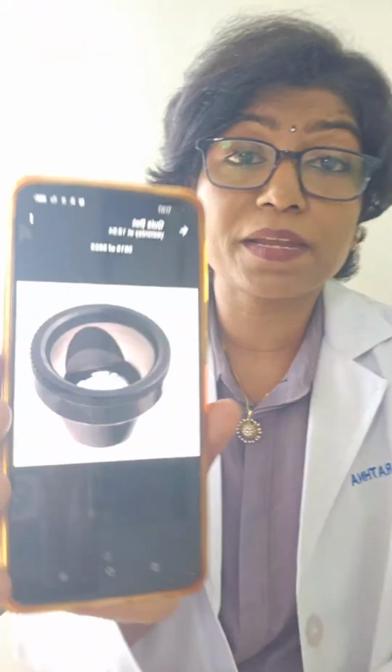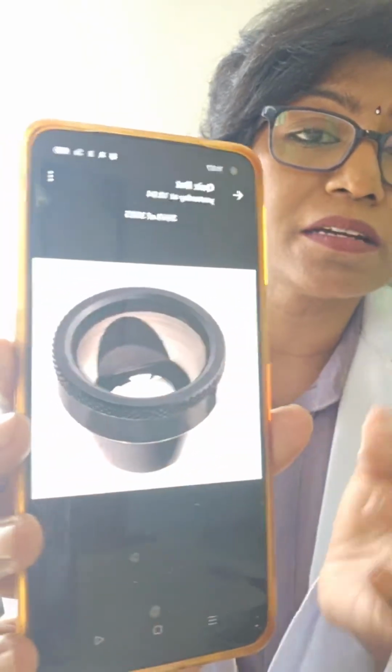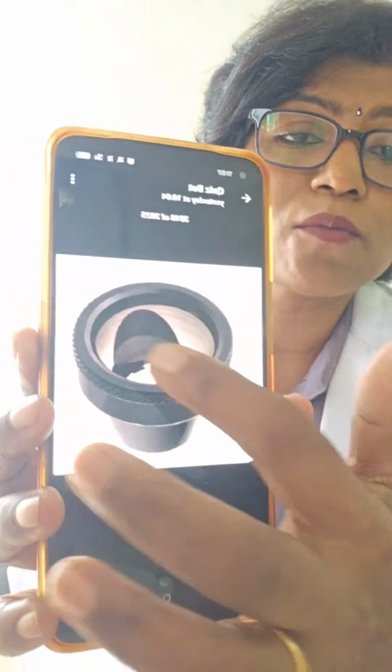Let's see what exactly is the question. This instrument is used to see all except. Okay, so for that I need to know what this instrument is. This instrument is a gonioscope. It's a Goldmann one mirror gonioscope. There's only one mirror, okay, one mirror. So it is Goldmann's one mirror gonioscope. So gonioscope is used to see all except.